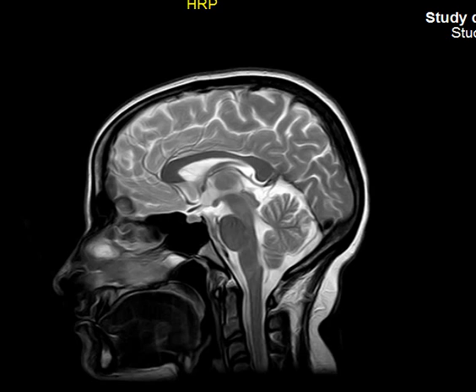What do we see? First of all, you look and you see this big thing here. This is called the corpus callosum. It's white matter, of course. It's a big bundle of wires connecting the right and left cerebral hemispheres, okay?